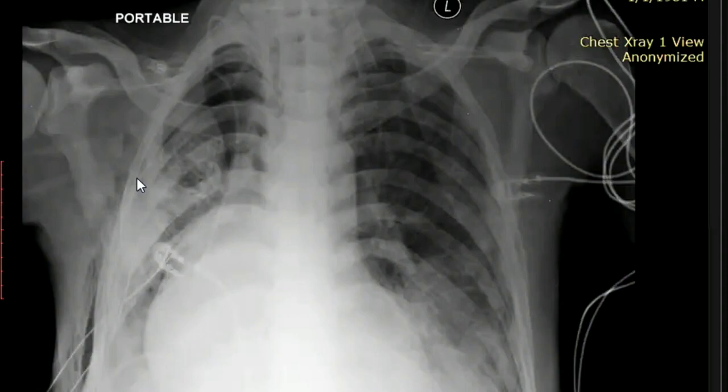Summarizing my findings, this is a patient in the ICU setting with a suspicious looking lesion in the right scapula with the right pneumothorax, widespread pleural lesions and a large cardiac shadow. So probably this is a case of right bony primary with pleural mass and a right-sided pleural effusion.